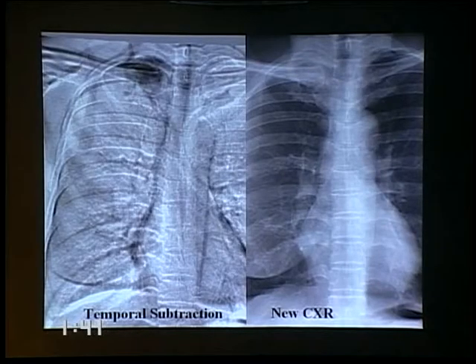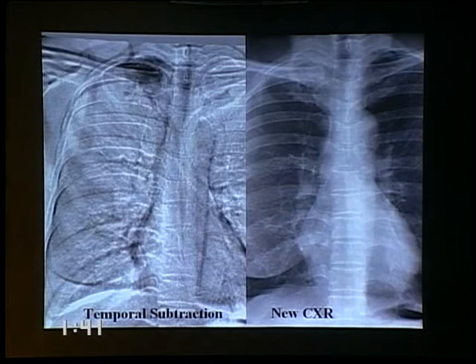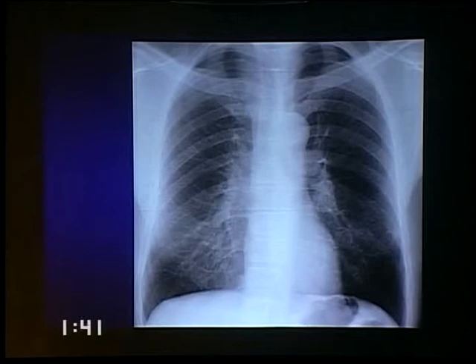So in this case that we were looking at with the apical abnormality, it stands out very obviously as a black patch. Again, it lights up almost like a PET scan. Yes, we do have artifact at edges and in the ribs, but these are pretty obviously misregistration, and again, with experience, one is not too bothered by them, but one is directed to this new opacity, which was actually a superior sulcus tumor. So this kind of subtraction technique can make things considerably more obvious.